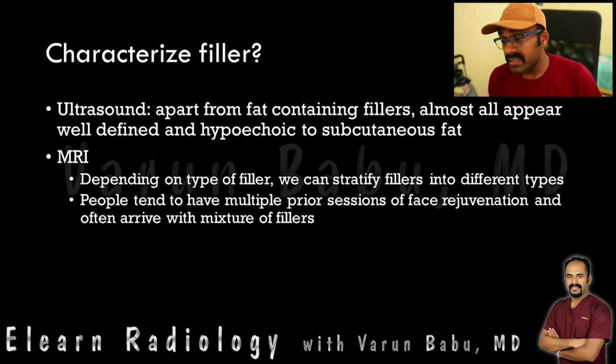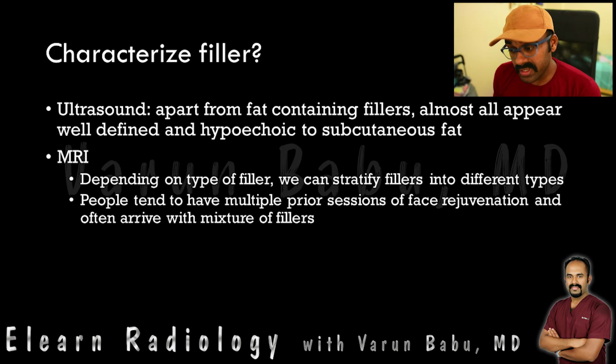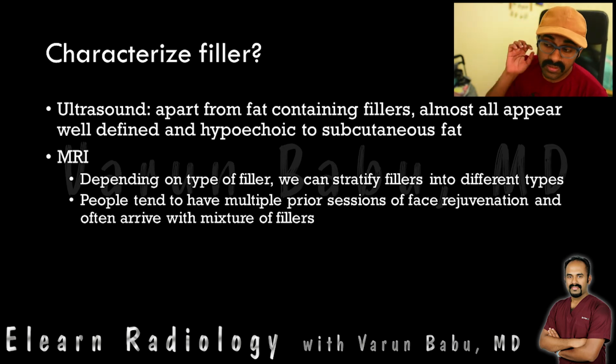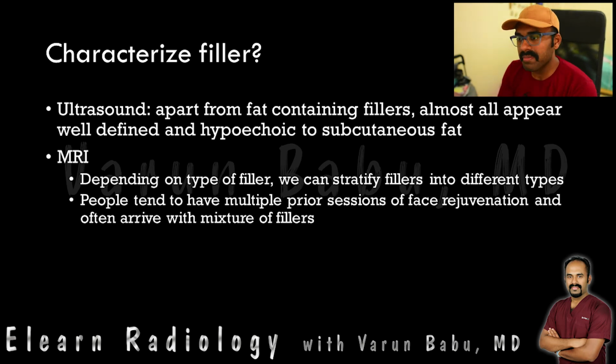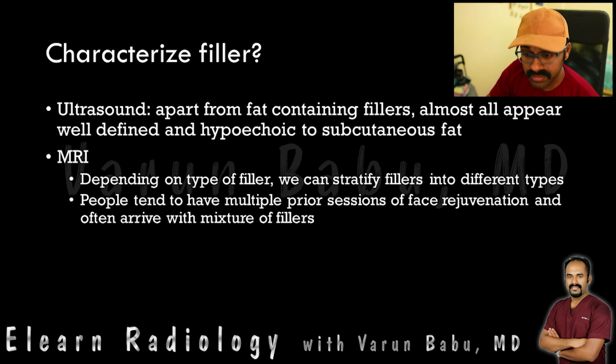With MRI, depending on the type of filler, we can actually distinguish the fillers based on the signal properties seen in T1 and T2 weighted imaging. People tend to have multiple sessions of face rejuvenation and often come with a mixture of fillers. So MRI might be helpful in characterizing what sort of fillers has been used in the patient.